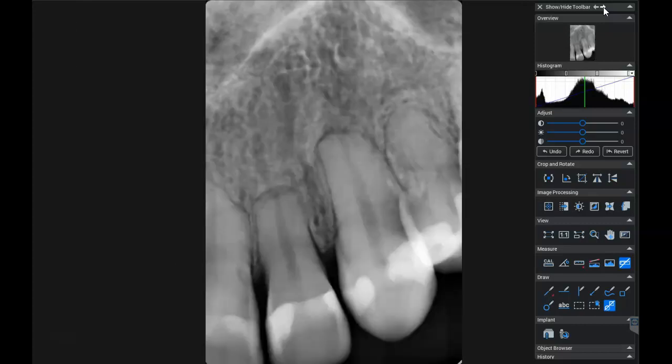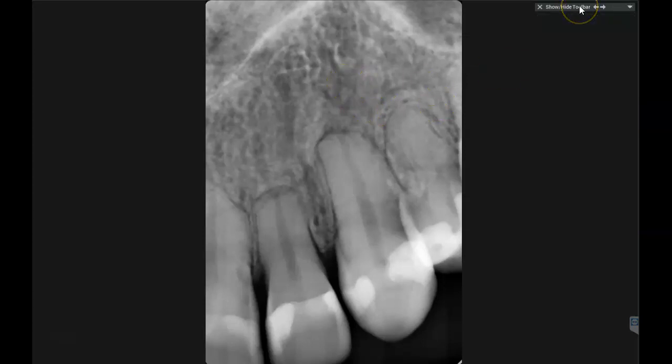No rhyme or reason, but it's very frustrating when viewing. Like right here, now I'm viewing this image. I'm right clicking and moving this around, but alas, there's an entirely different thumbnail up here. How that happens, no clue.